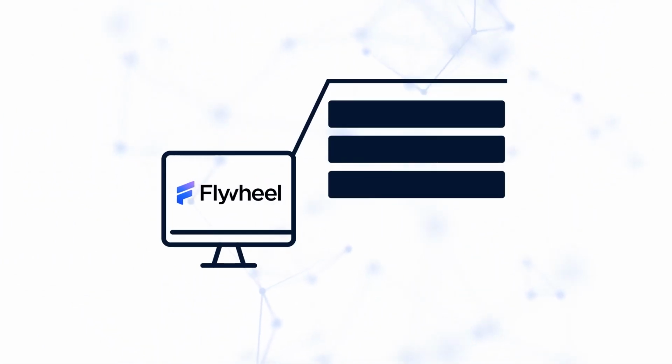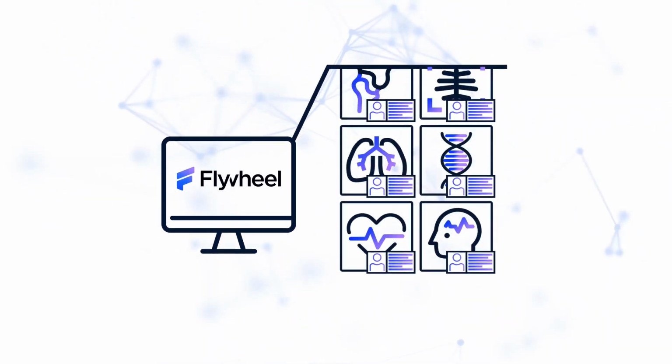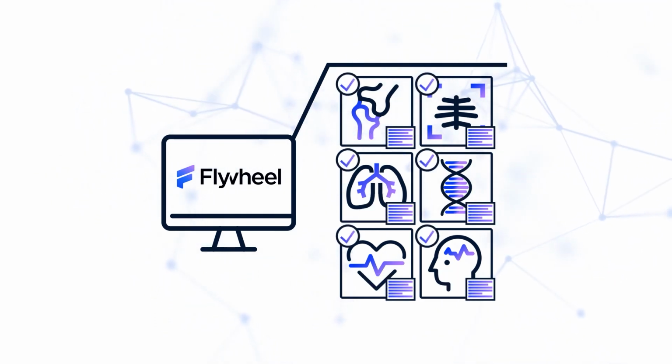You can easily filter data by factors like modality, sex, or age using advanced search. Custom templates fetch structured metadata on demand, and Flywheel's configurable de-identification ensures your data is compliant from the start.